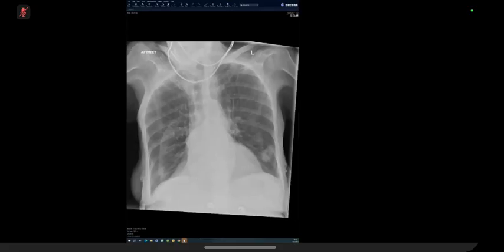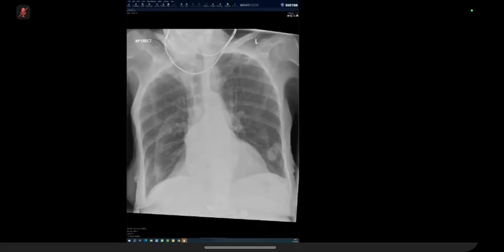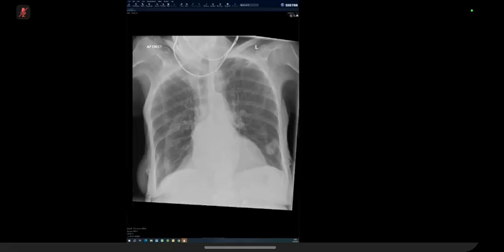Okay. And you're sure you want to move on from this X-ray now? When an examiner pauses and doesn't really want to give you the next study, it's usually for a reason. If I was to say this left lower zone or left lower lobe, whatever this is, ignore it. Pretend it's not there. You're saying this is a skin fold. I agree this is a skin fold. I agree this is an opacity. Pretend this opacity isn't there. Pretend this skin fold, we've already established it's nothing. There is nothing else wrong with this chest X-ray?